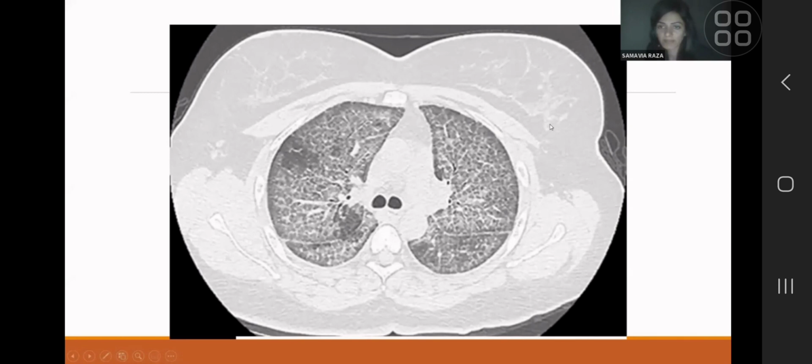But yes, I agree. That's a very good differential. Pulmonary edema definitely would be in there if this patient was an acutely unwell patient. And because alveolar proteinosis is known to have a patient that looks like me and you, they would be completely normal, walk in and have a horrible looking CT. If this patient was unwell though, pulmonary edema doesn't look this pretty. What you do get is dependent consolidation, a bit of fluid, the heart is too big. It's a messier looking picture in pulmonary edema.